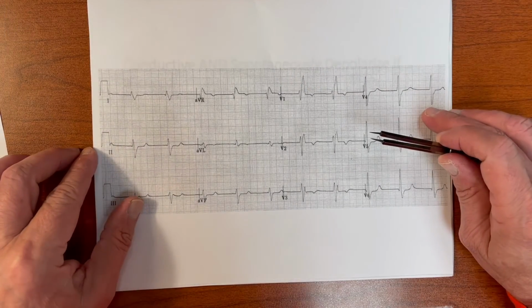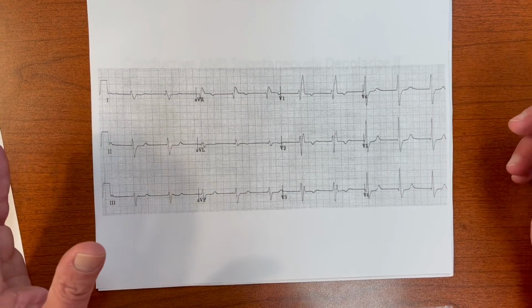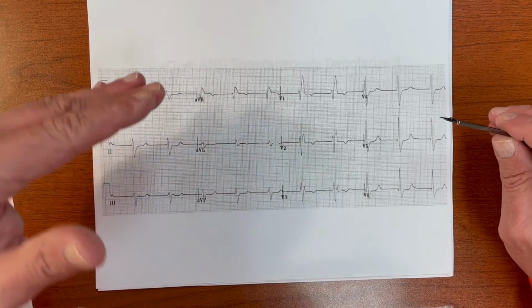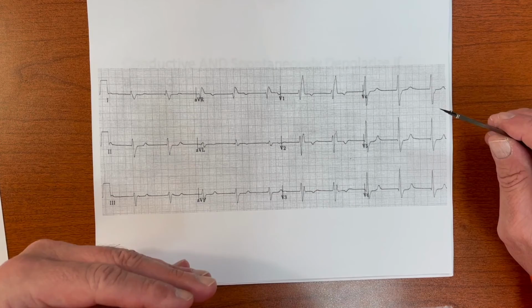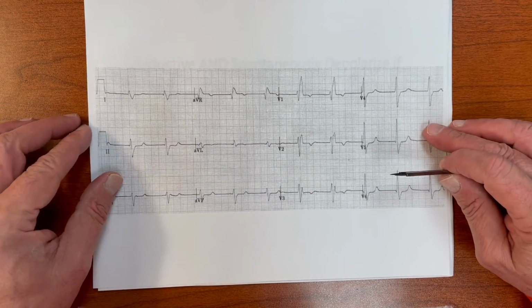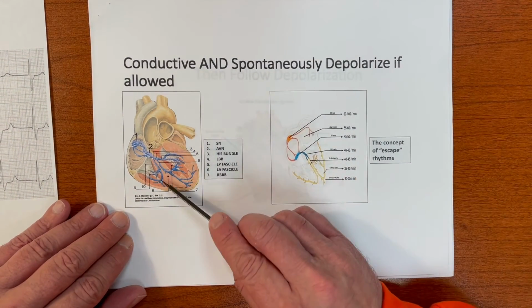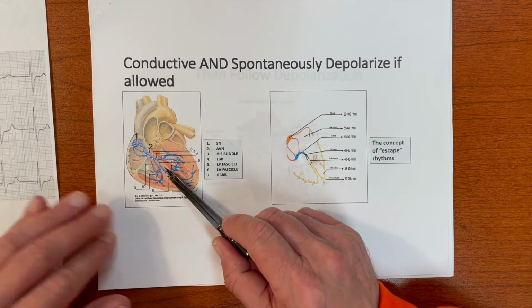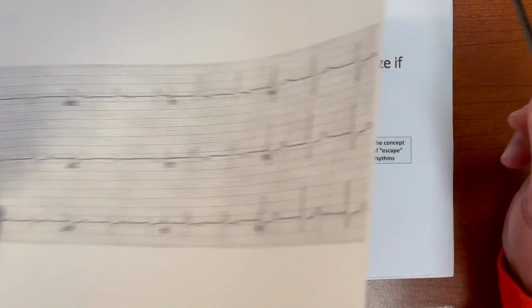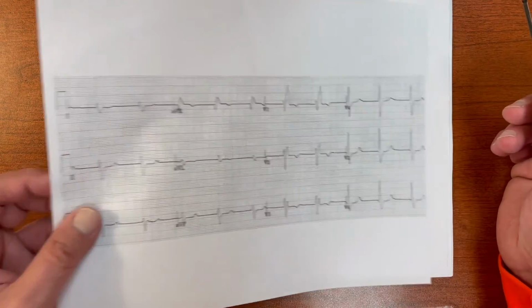That's right, and we're going to get a more detailed explanation of telling right from left bundle. But remember, right now we're just going through the method. So we're just showing a normal QRS versus being able to recognize an abnormal QRS. What you were mentioning is absolutely the truth, and the concept in general is just like this. So this is right bundle branch block. Both of the bundle branch blocks have a wide QRS.